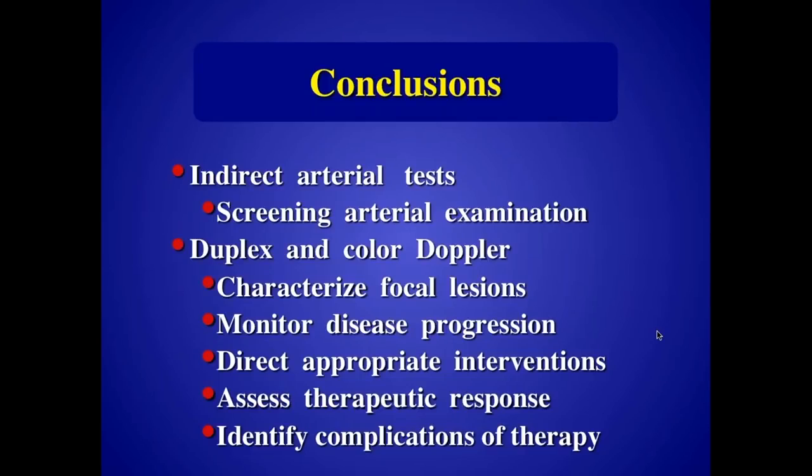And the answer to that is yes. It may not work on all occasions, but if there's any obstruction to blood flow coming from the thoracic aorta, then you may see an abnormality in the waveform. It could be reduced velocity. It can have a tardus configuration because there's outflow obstruction. So abnormalities in the carotid waveform usually will, especially if there's a delayed upstroke, indicate there's a proximal lesion.